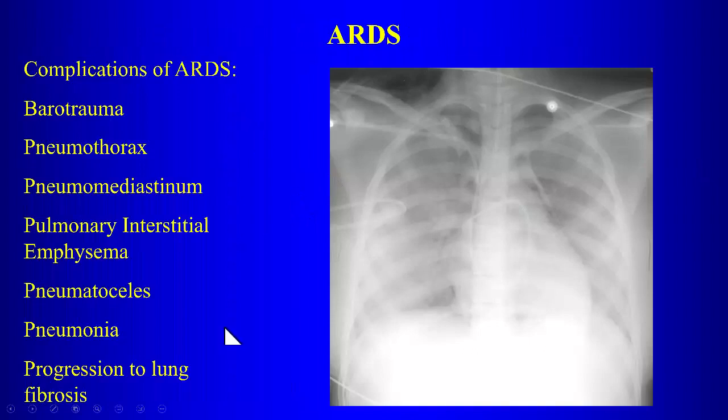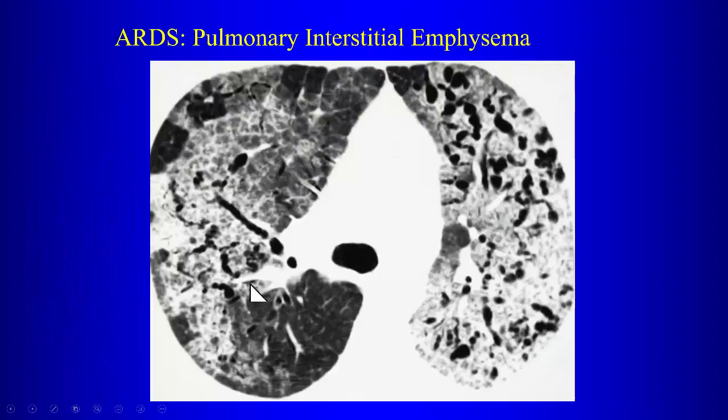Many complications of ARDS can be related to barotrauma. Another one illustrated here. What's the complication? You're reading this chest x-ray, you're going to stare at it blankly like this for pneumomediastinum. Yes, right. We want to recognize that, right? When we're reading a chest x-ray, you want to be able to recognize pneumomediastinum right away. So barotrauma, very common complication from ARDS.